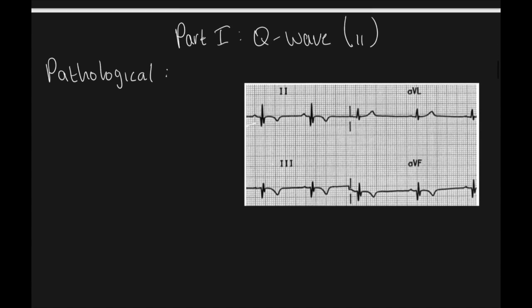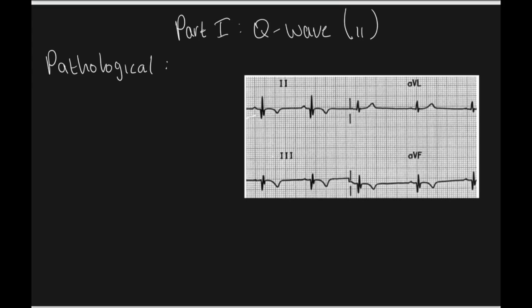Some pathologies associated with a Q wave. If a Q wave is present and it's greater than 40 milliseconds wide, that is concerning. If it's greater than 2 millimeters deep, that is concerning. Again, that is not including AVR.